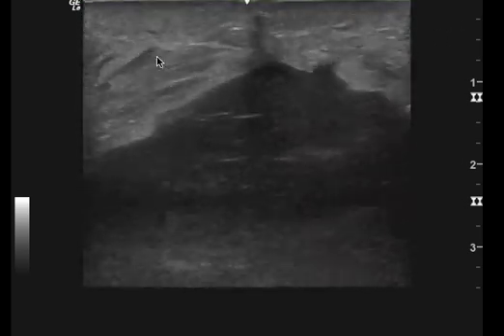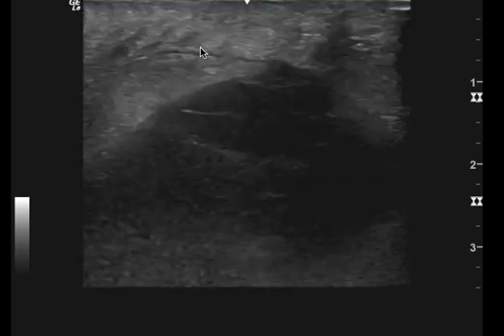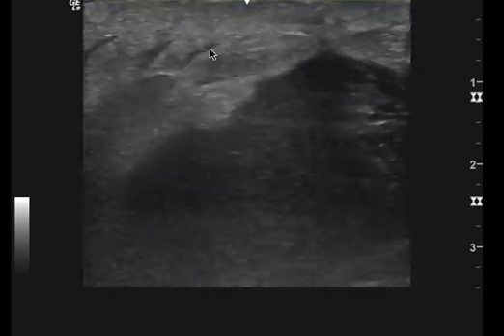This is a soft tissue ultrasound. A couple things I want to point out. There is cobblestoning, to me. You can see it over in this area. Cobblestoning doesn't necessarily mean that there's an infection. It just means that there is inflammation. I think you do see these areas of hypoechoic findings.